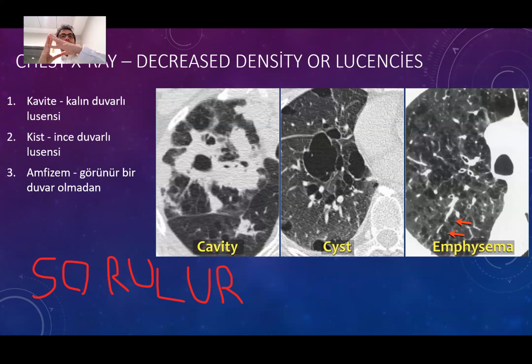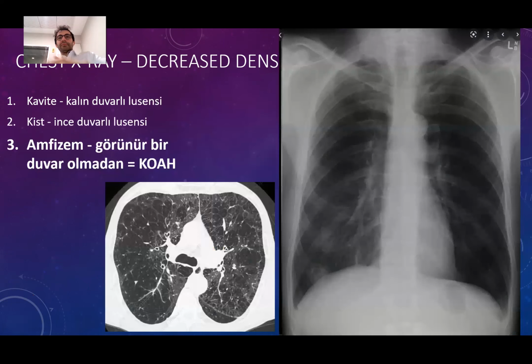This is another source of, yes, please. For X-ray, the previous one. Yep. Can you define the lesions here in the chest X-ray? Very good question. Doctor, can you please define the lesions? You can't, because there is no lesion. It is absence of density. So there is no density here. There is increased lucency generally.